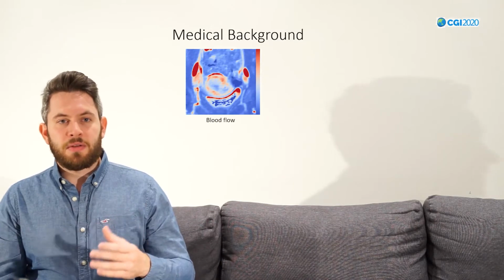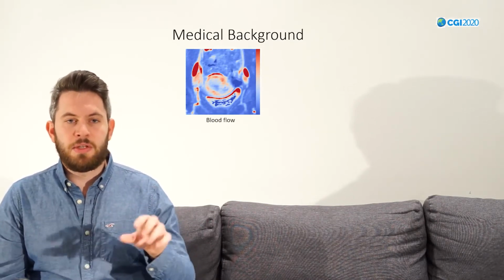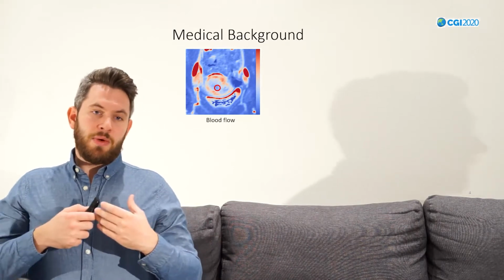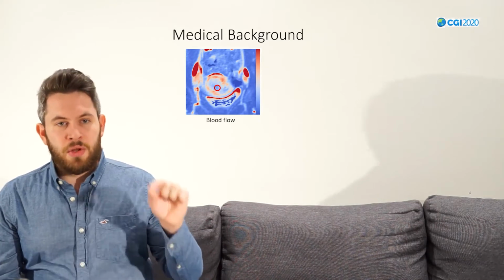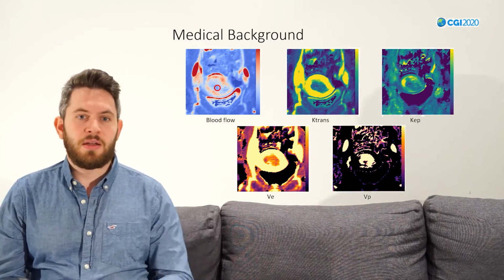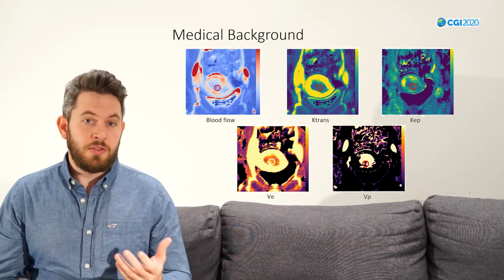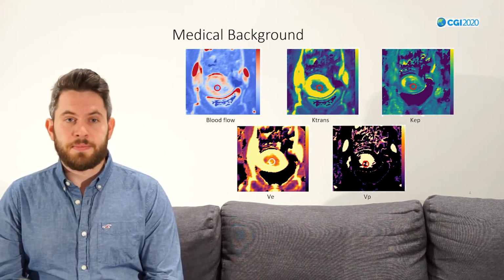To the medical background, endometrial cancer is a cancer which is within the uterus, within the endometrium. When we have a look here, for example, at the blood flow, one possible question could be, how is the value distribution within the circle that we drew here? But they are not only interested in this one circle in the blood flow, they're interested in many circles in all, for example, here 5 modalities that are present. And this circle is not fixed, they cannot tell now which area within the cancer is interesting. They want to move it around and explore the tumor interactively.